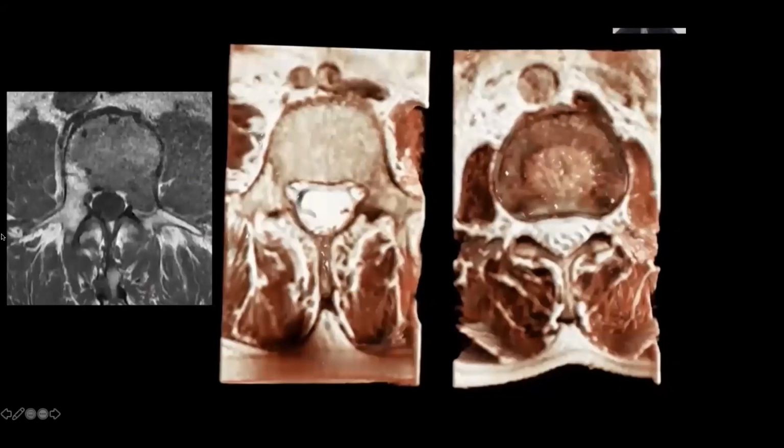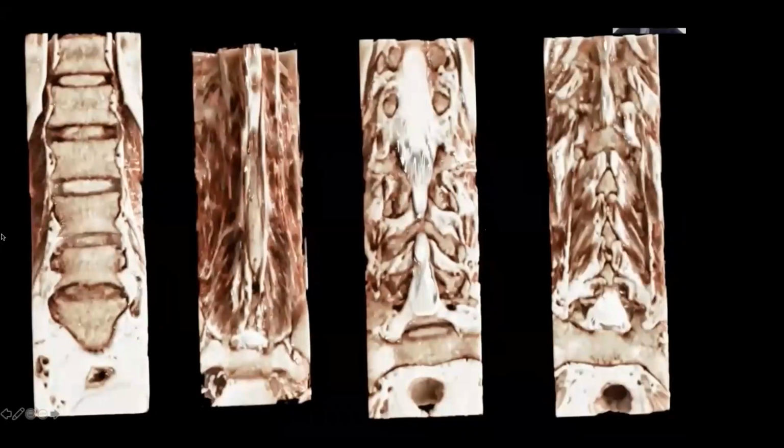Again, we can do this on cross-sectional view also. You can see the disc really well with the annulus fibrosus and the nucleus pulposus, really better than we would typically see that. We can see the detail of the bone better than we would typically see it, including the trabecular architecture here. And we can see the individual musculature of the erector spinae. Starting to see the iliopsoas come in there. I'm not sure what level that was taken at.